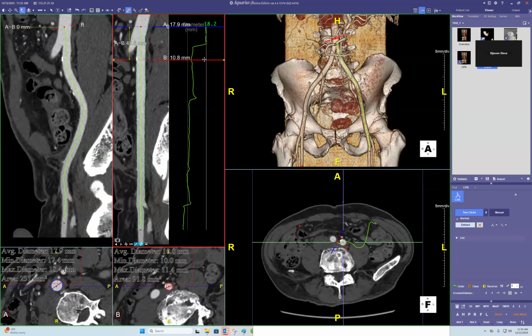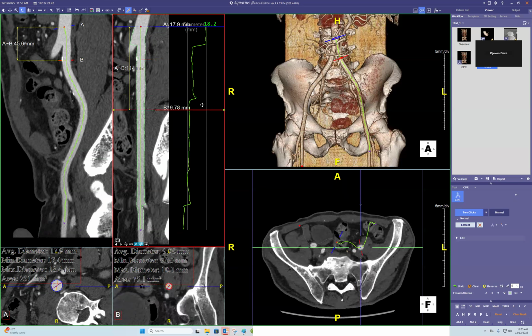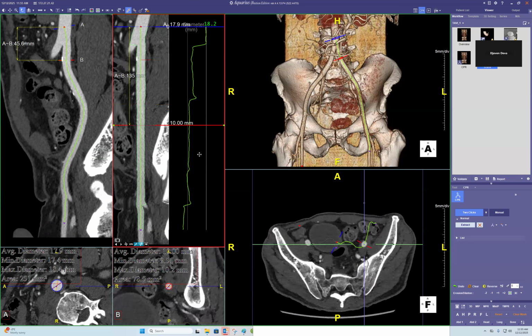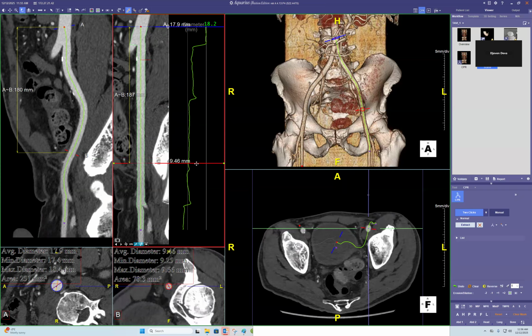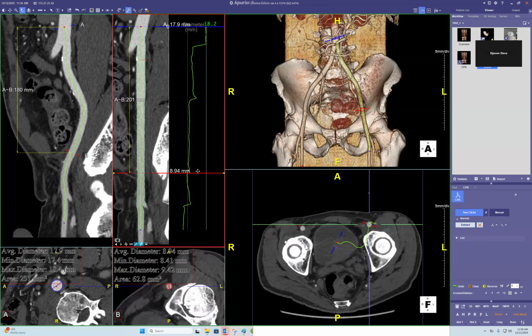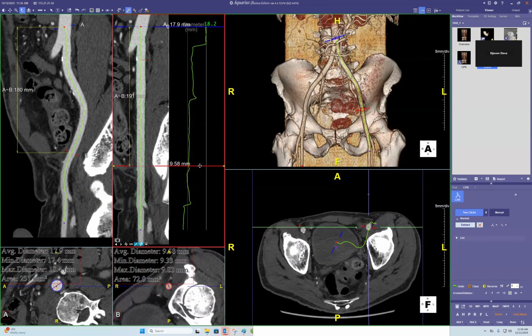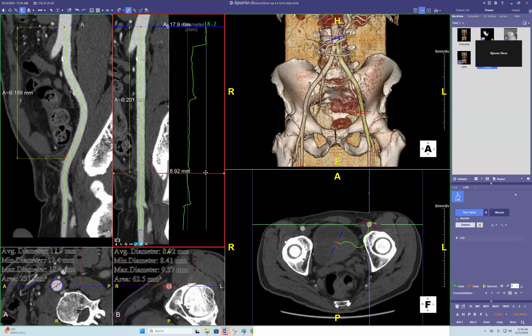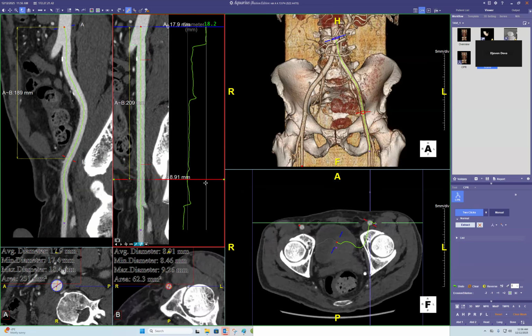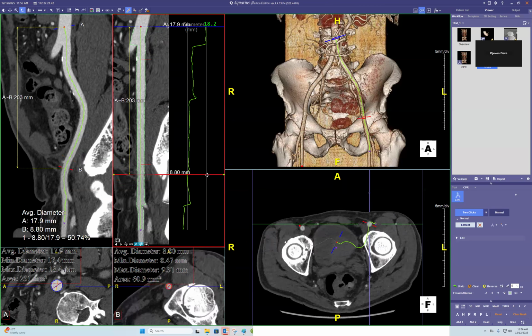I'm finding the lowest point on this curve, marking it with a 1 second click. Same here, 9.7, and I'm keeping one eye on this panel. 9.5. 9.5 seems like our nadir. So 9.4 maybe. Okay, a 1 second click. And then I'm down in my femoral system, and I think 8.8 is my lowest number, marking that.